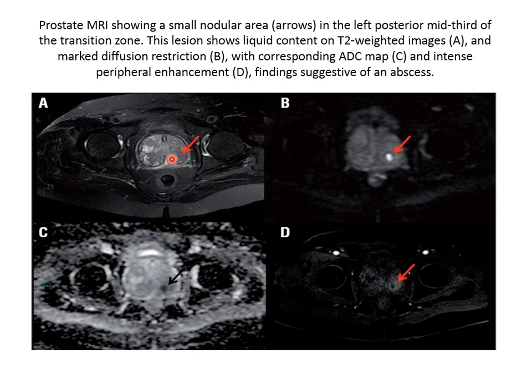About the MRI of the prostate, you see there is a small nodular area in the transitional zone, and when we do ADC, there is restriction, and there is peripheral enhancement. These patients will have elevated PSA, prostate-specific antigen. It may be difficult to differentiate it from cancer, but the restriction will not be as marked as in cancer, and the enhancement will not be like prostatic cancer.